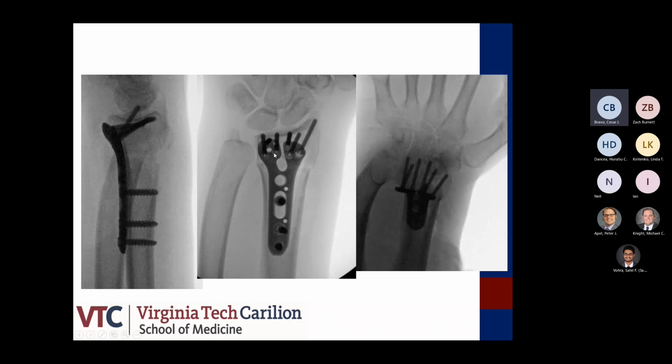The thing is, you criticize yourself going distally, and I would correct. I think with these is when you really need to go distally. Look how much dorsal comminution you have. Your only fixation, and that's what makes these volar locking plates, is actually to use that subchondral surface fixation which you have. And the mistake I've seen is that you go too proximal, you don't use your subchondral support dorsally, and then they collapse, or they actually don't get reduced, and you don't have that opening that you have there. That actually shows you on that lateral that you've opened and got the length.